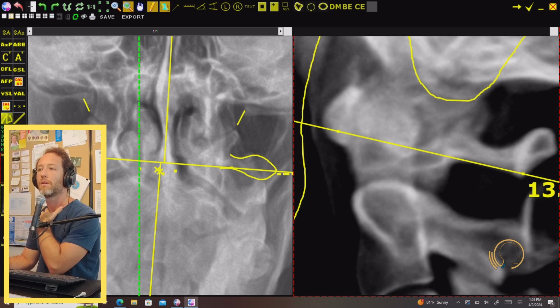All right. So if I look, right, this is overall the dens here. But I start to notice I have some white, heavier on the white here. And I'm looking for this little edge I can see.